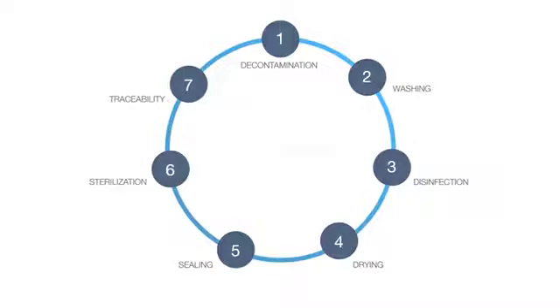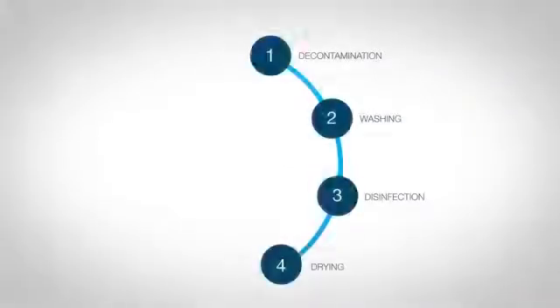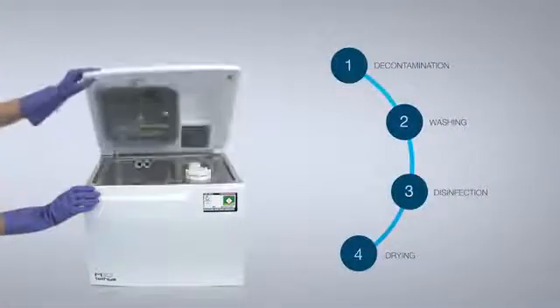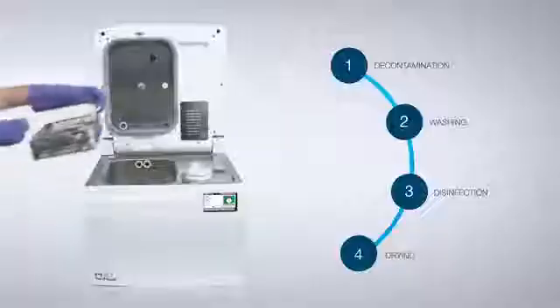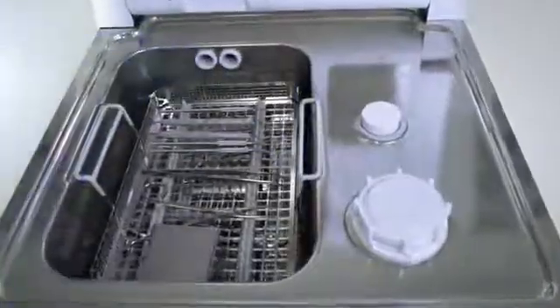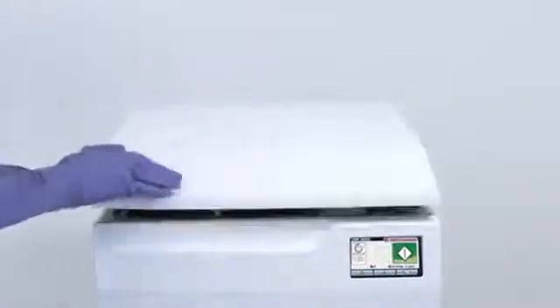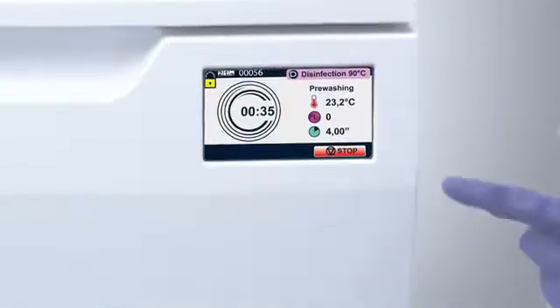We will now demonstrate how our solutions speed up the process and reduce the risks involved. By merging the following 4 steps into one single device, you can significantly reduce both the processing time and the risks involved. A totally automated process is safer as there are fewer manual steps, and you are sure to obtain consistent results.